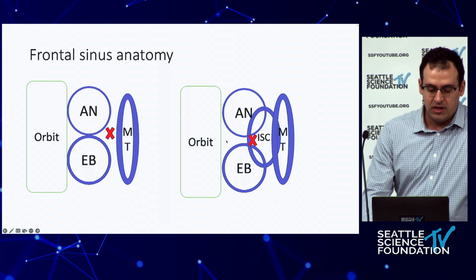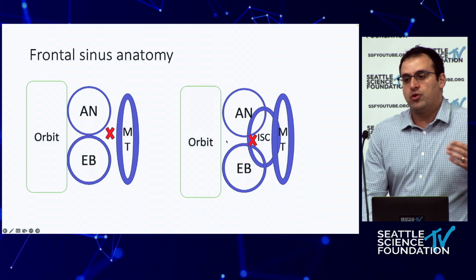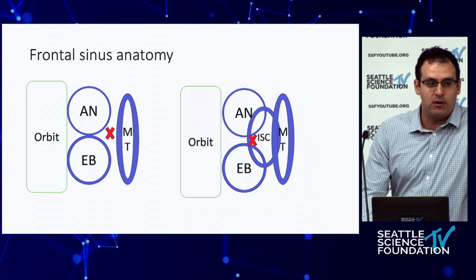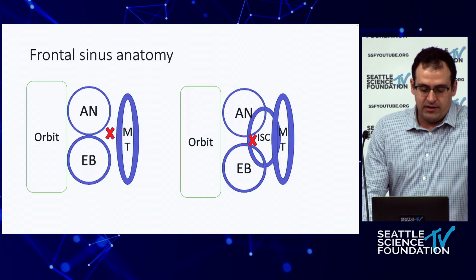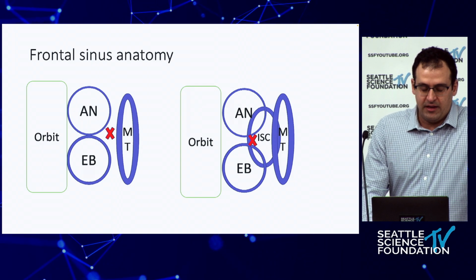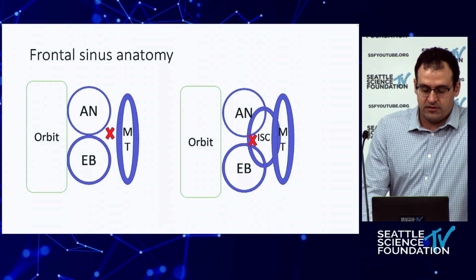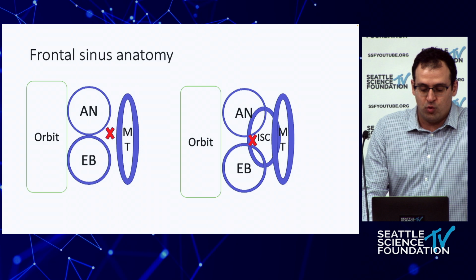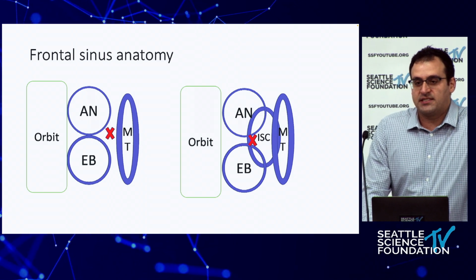So in preparing for that, look at the multiplanar view on your CT scan to anticipate what your frontal sinus anatomy looks like. The presence of other named cells, whatever naming convention you use, is important so that you're prepared to fully open the sinus and you're not fooled by getting into just a supra agger cell or only into an intersinus cell.